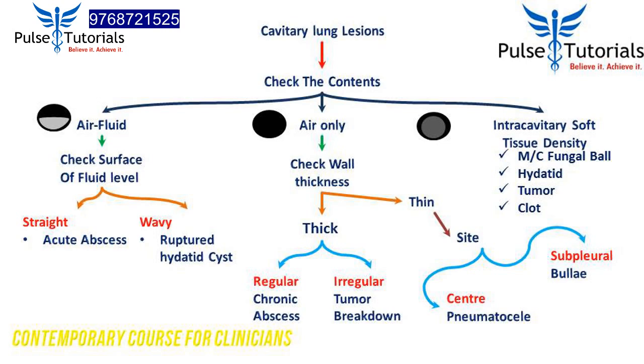The air fluid level cavity, you have to check the surface of the fluid. If the surface is straight, it's an abscess. If the surface is wavy, think hydatid cysts. Which leaves us with air only cavity.